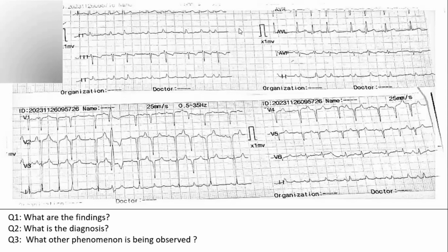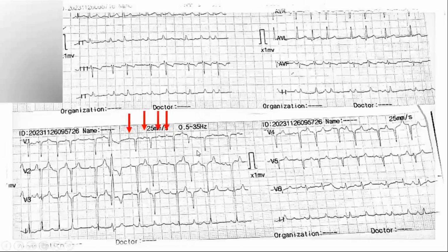Premature, like atrial beats or ventricular beats? It looks like APC, sir. Atrial beat, APC. Yeah, these are APCs, but look at this. What would you think the rate is like?